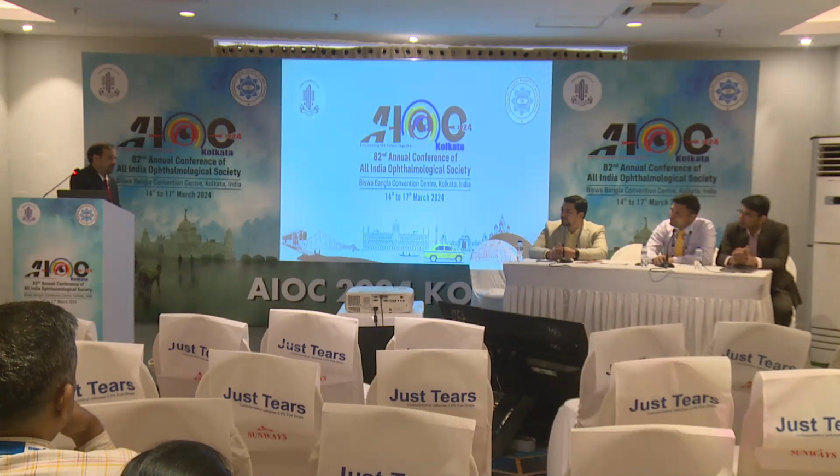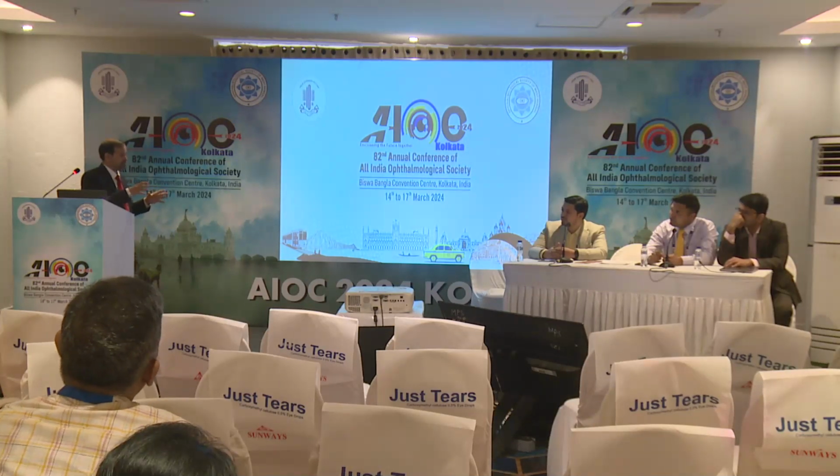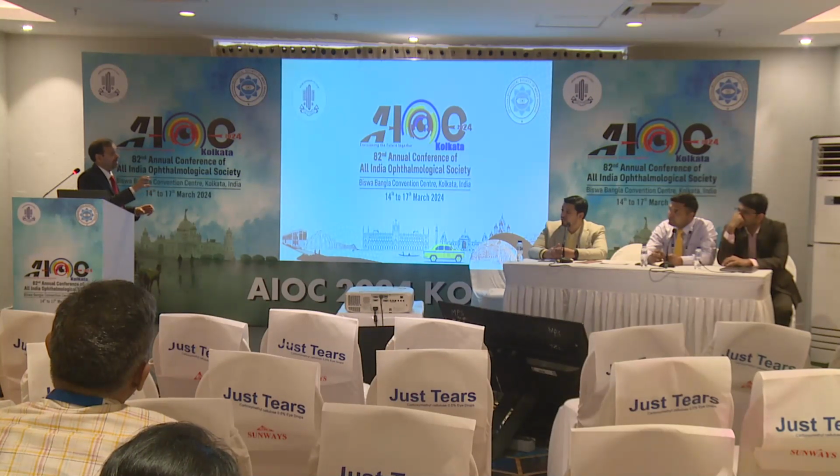The reason being, with ultra wide field, we know that there are two kinds of diabetic retinopathy. One kind predominantly involves the posterior pole, while the other involves the peripheral retina. We call it predominantly peripheral lesions, and it has been shown conclusively that patients who have more peripheral lesions tend to progress more. So I think 130 degrees is still kind of mid periphery and we are not able to see the periphery. In one of the newer diabetic retinopathy protocols, they have shown that the FFA lesions which you see on the periphery are actually a better predictor of progression than the clinical lesions which you see in the periphery. That is again a very useful thing which has come from ultra wide field FFA. And I think once we have 200 degrees, then probably it would be good enough.